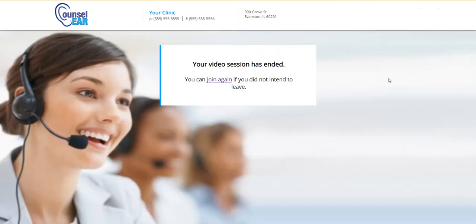You also have the ability to perform a screen share. So if you want to flip this over and show your screen, you can do so with a single click here. When the telehealth session is complete, go ahead and click the hang up option. Of course, the patient can hang up as well. And of course, that will end the session. Now, if you did that inadvertently or just too quickly, you can go ahead and click join again, and that will add you back into that session.